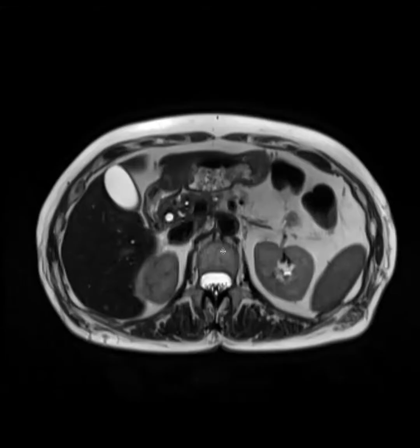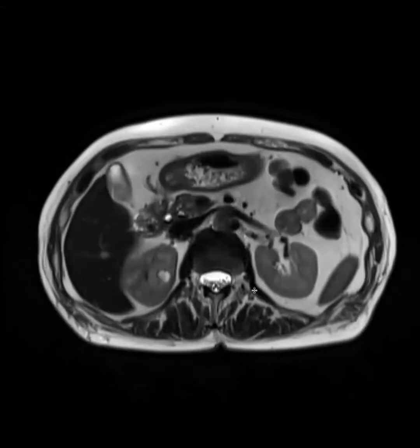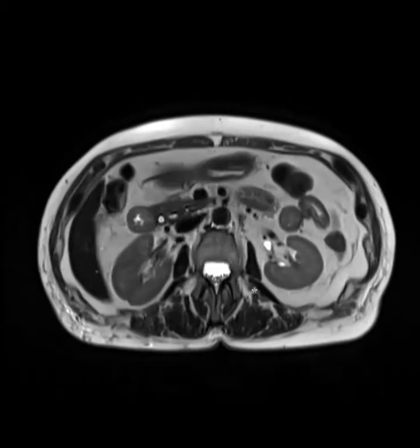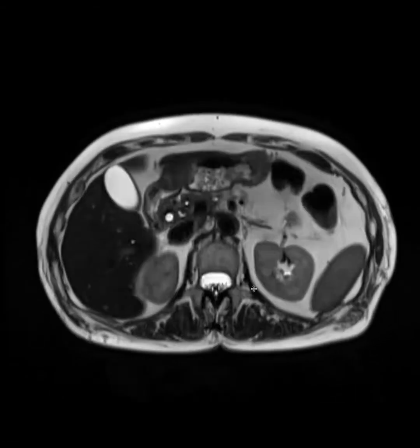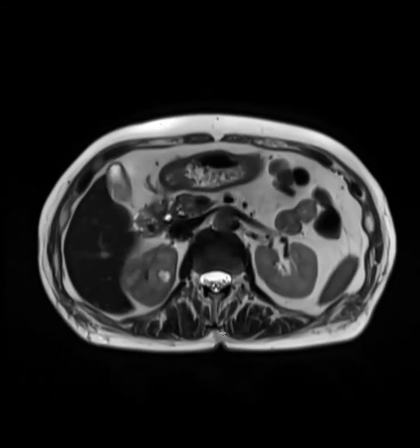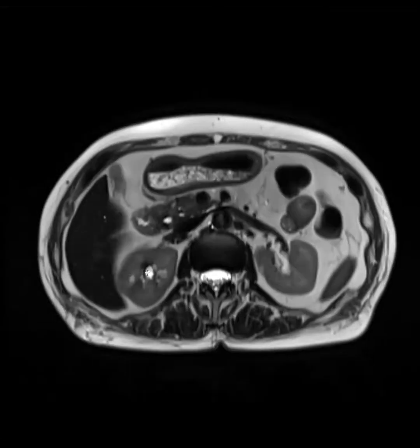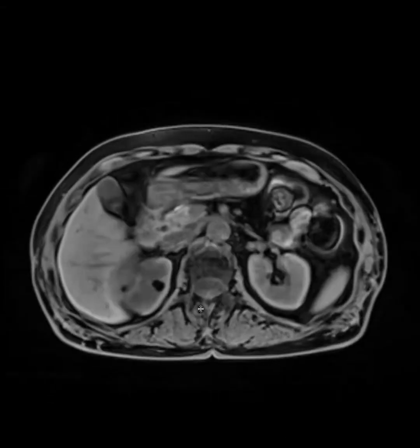Okay. This patient came in with a history of renal masses. So it's here. The T2 hyperintensity on the right kidney? Yes. So far, it just looks like it could be a cyst, but it does have a little bit of a capsule and maybe some internal complexity. It's really dark.